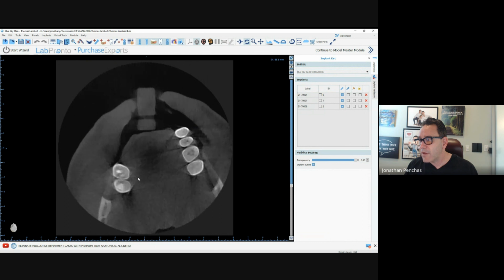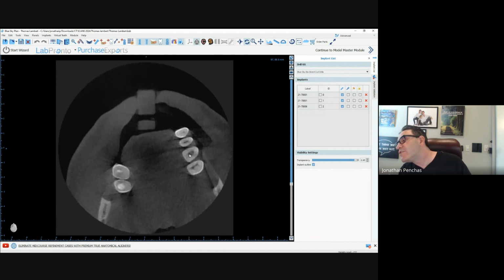And here's 1, 2, 3. And I'm looking for MB2 in it. And there are times when I can find, here's 1, 2, 3, and here's MB2. Let me try and increase it so you could see where MB2 is. See if I can make it any larger.